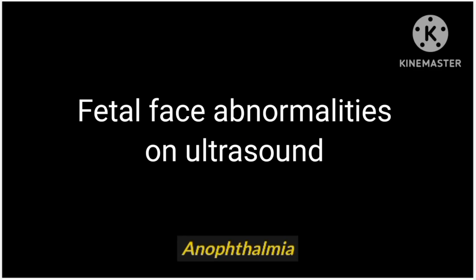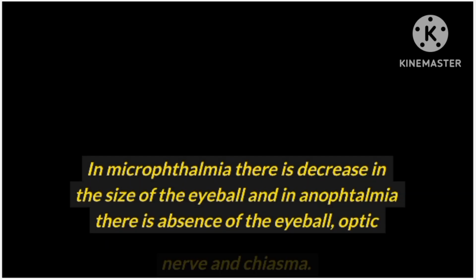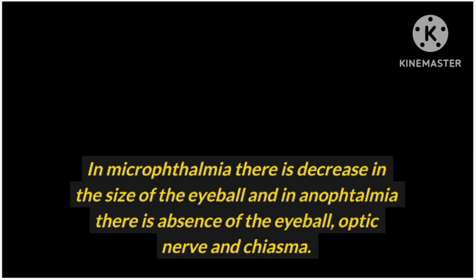Face abnormalities. Anophthalmia. Ultrasound diagnosis. In microphthalmia, there is decrease in the size of the eyeball, and in anophthalmia, there is absence of the eyeball, optic nerve, and chiasma. Both can be unilateral or bilateral.